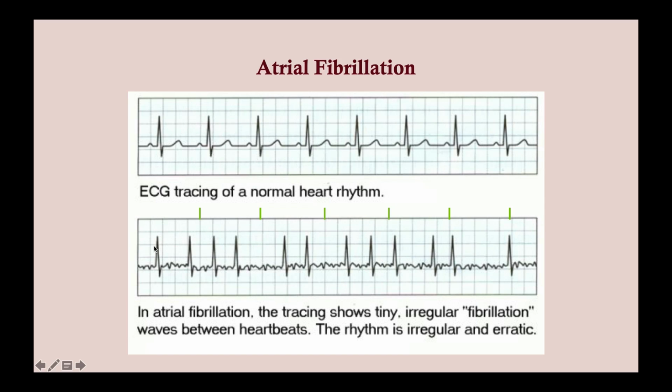Now, you probably won't be asked this on the USMLE, but you will be expected to discern the heart rate of a patient with atrial fibrillation. That's not always that easy to do because it's irregular. But really, all you need to do is go through 6 seconds. Remember, each second is 5 big boxes, so 30 big boxes. Count the number of QRS complexes, and then multiply that by 10, because we're going 6 seconds here. So here we have 4, 5, 6, 7, 8, 9, 10, 11, 12, multiply that by 10. This is an irregular rate of approximately 120 beats per minute.